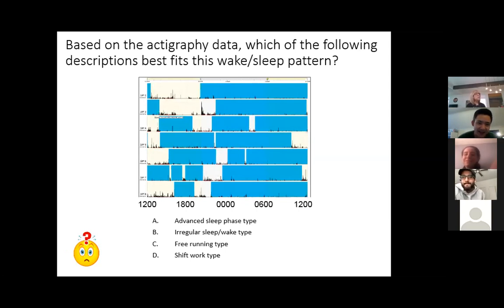The problem with this one is I think they haven't cranked the sensitivity up enough. So if you can imagine this blown up a little bit, but think about a nursing home and a demented person. Just sleep, wake, it's just a lot of sleeping. So this is a sort of a classic.